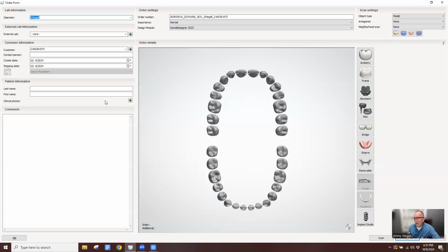What it does is it analyzes a scan of a denture, and it has to be a 360 scan. It has to be a watertight scan to do this, and it will virtually separate the teeth from the base unless you just want a quick monolithic copy. So for a surgical denture or something that we need in a hurry, the workflow is exactly the same. The only thing different, if I just want a monolithic copy, I just don't select any material for the teeth, and it goes right through. It takes like two steps, and then boom, you have a copy.